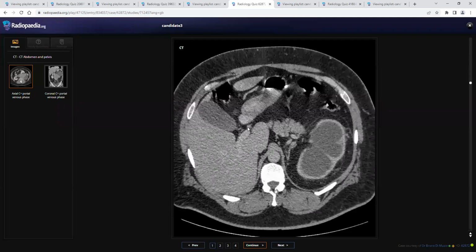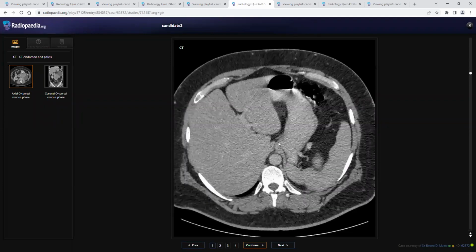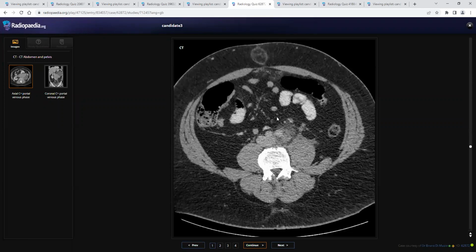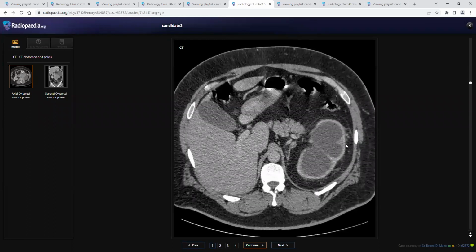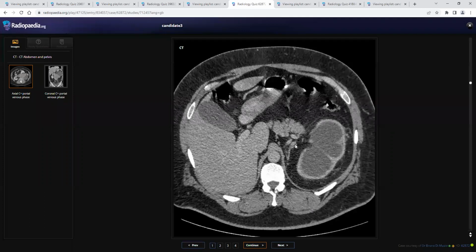The liver, pancreas and spleen appear unremarkable. I will urgently refer the patient to relieve the obstruction in the left kidney, as it is more urgent at this moment. After that, I will advise referral to the gastroenterology team to discuss the patient in MDT and manage accordingly.